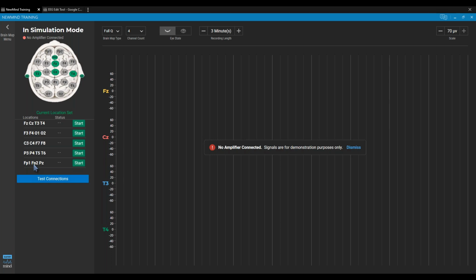But another thing, let's say you've got a new client, it's a kid, and you want to know before you waste any time, am I going to have to shut off the auto artifacting or not? With kids, or let's say you've got even an adult that maybe has an essential tremor, or a small tic disorder somewhere in the facial muscles, instead of running in the order that we have them set, I wouldn't go top to bottom here.